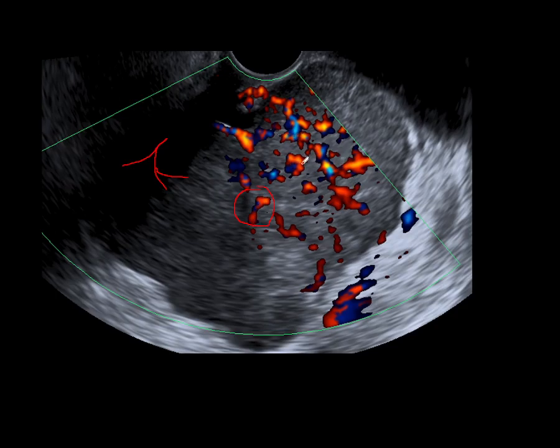Now really deep in heart of hearts, I'm pretty sure this is convincing too, but sometimes it can be tricky, and if you just see these sort of areas here, perhaps if you shake your hand around when you're taking the pictures, you can often produce this sort of artifact. So this branching pattern is what we're looking for. You won't always see it, but it's certainly something to be looking for. We'll see it again in a second.